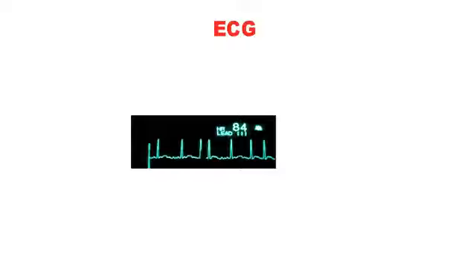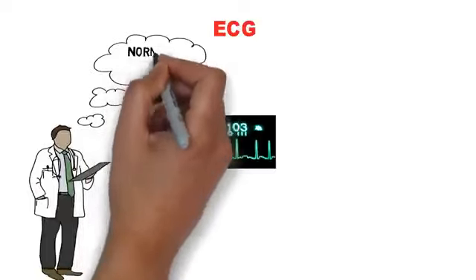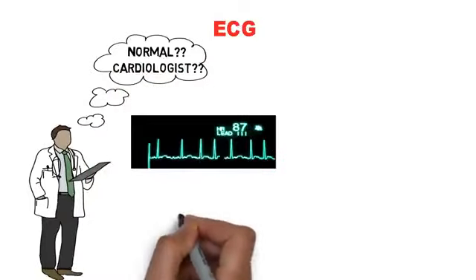We'll discuss ECG. This is by far the most important topic for all the medicos. Sometimes you get confused after seeing the ECG. For example, like this. And you think, is this normal? Should I call the cardiologist?